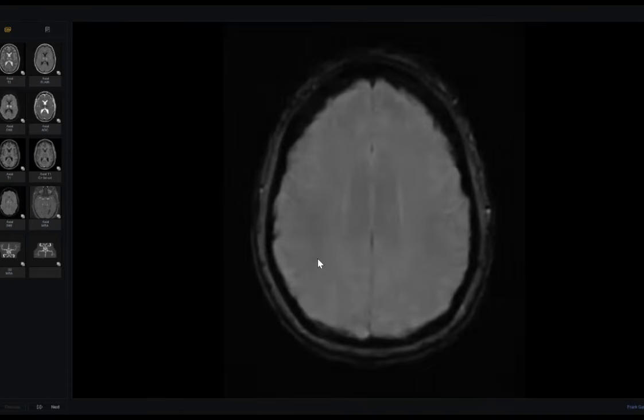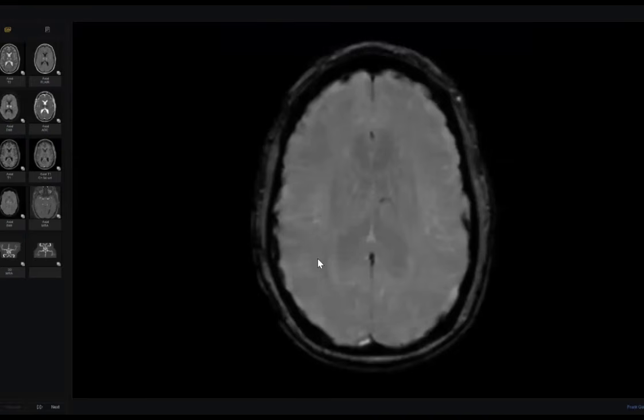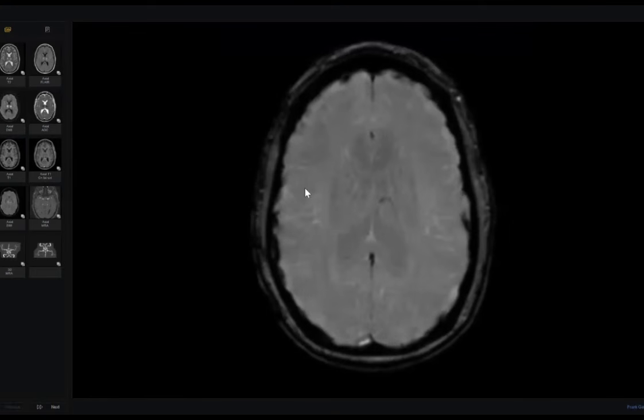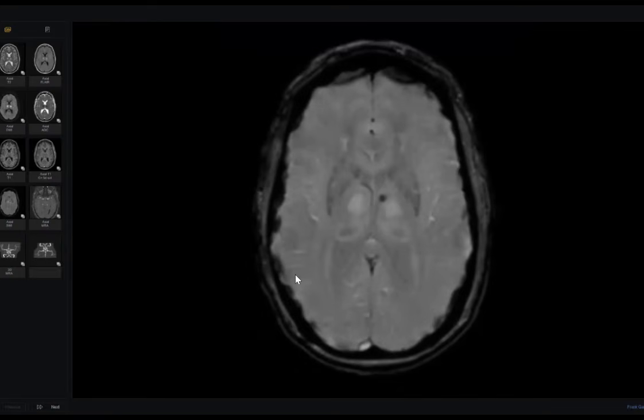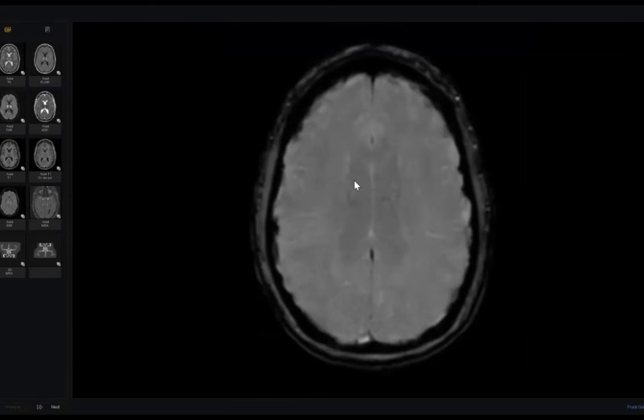All of these, especially the cortical veins, are superficial veins, but we have the deep veins. What are the deep veins here? Perpendicular to both ventricles, there are the medullary veins. One is very clear, look here. These are the medullary veins. The cortical veins drain into these medullary veins, go down into the subependymal veins, in both sides, by the way.